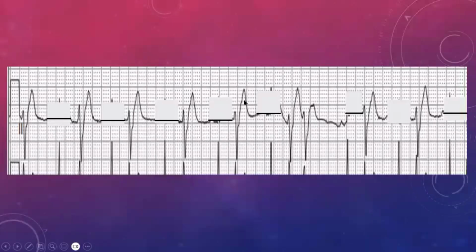But essentially what's happening over here is that the heart has realized, listen, I've gone into a bradycardia just from my atrium. My SA node is not giving me enough stimulation to keep myself going. So I've got to put in extra beats, all right, or ectopic beats, or rescue beats, or premature ventricular contraction, whatever you want to call them, in order for me to keep up my BPs, in order for me to keep up the amount of volume that I'm pushing through. So that is what the heart is doing.